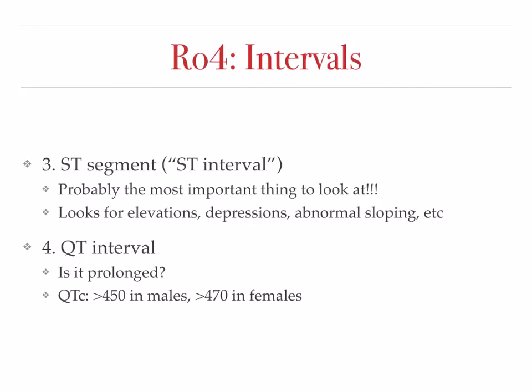Next, we take a look at the ST segment, also known as the ST interval. This is probably the most important thing to look at emergently in the ER, especially for patients presenting with chest pain. Look for any elevations, any depressions, or any abnormal sloping, etc.